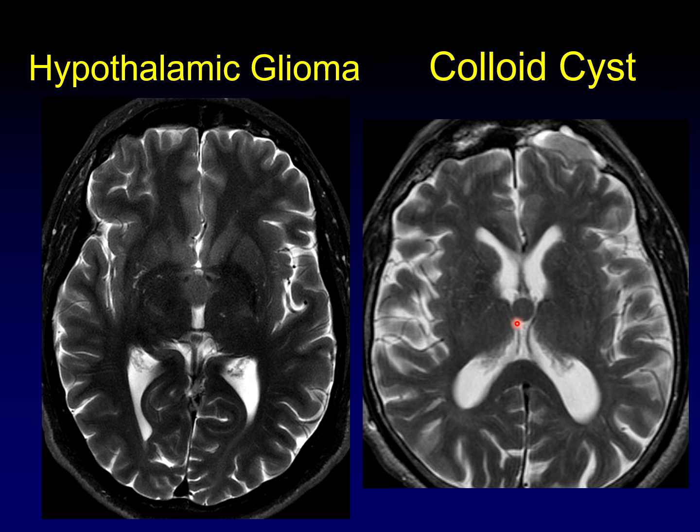I think that the trap here is to see this in this location and come to a snap judgment that this also is a colloid cyst, when in fact this patient had the colloid cyst.